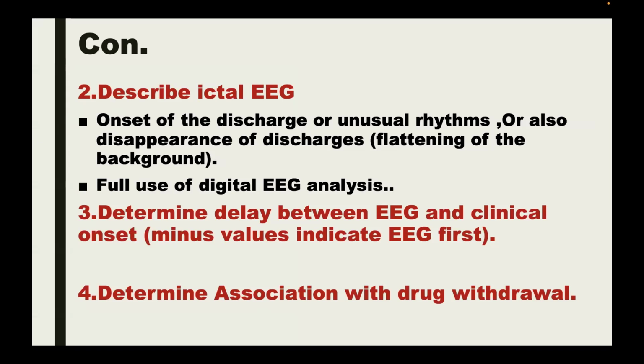We will also mention the ictal EEG pattern, focal. So the onset of the discharge or unusual rhythm, or also disappearance of the discharge, as we say, flattening of the background. For digital analysis, we can also use quantitative analysis. So we describe the ictal event as I mentioned before. Third one: determine the delay between the EEG and clinical onset.